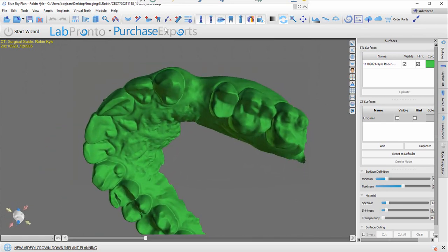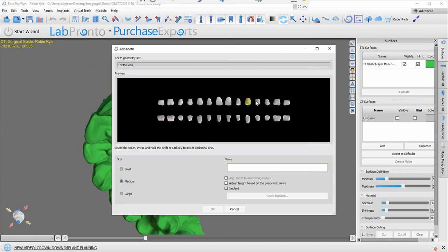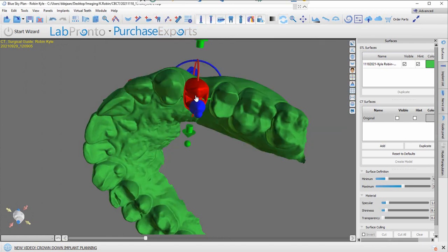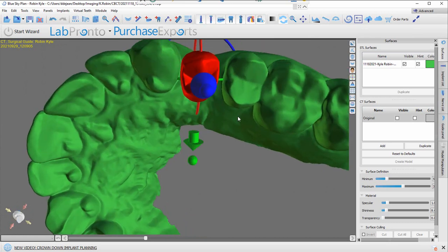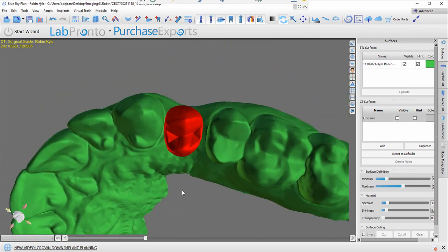So you want to import a tooth. So click on the tooth. Click on tooth number 12, right? And then you've added the tooth. So you'll wax it up. All right. There's a couple different nodes. This goes mesial distally, right? See the expansion? I'm sorry, buccolingually.